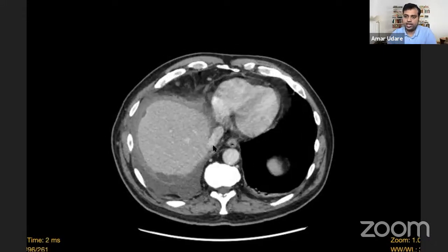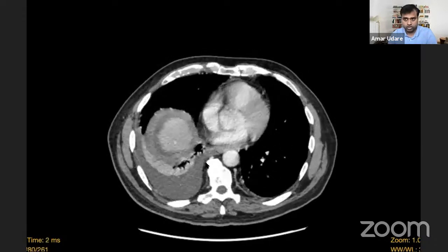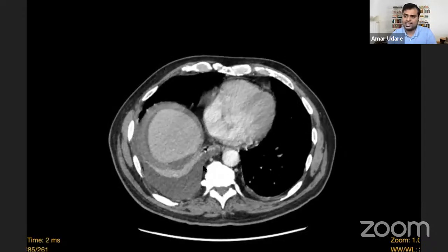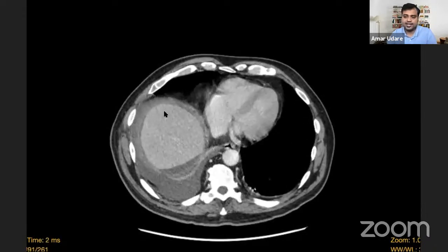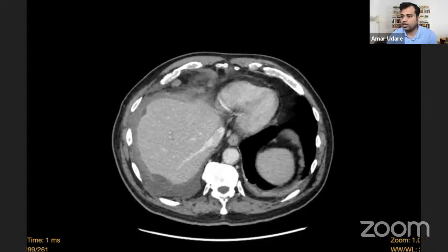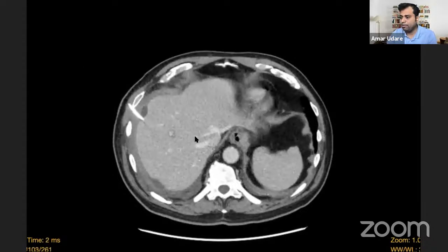In fact, I did not think about it. I thought that usually whenever we see any post-operative case, there's effusion. But that was a mistake on my part, because this amount of effusion is pathological. So the first thing they said was, this effusion is abnormal. Why is there this much effusion? The next thing they did was look at the coronal CT. Unfortunately, I don't have the coronal images, but then we went on to read the notes.